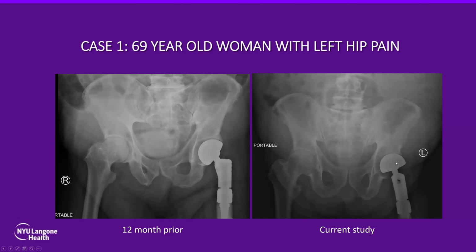But we know that for a bipolar hemiarthroplasty, we have one level of motion between the cup and the acetabulum. So it's a normal finding. So this was a tricky question. I wanted to trick you into saying that this was a total hip arthroplasty and the acetabular component has rotated, but that's not the case. This is a hemiarthroplasty, a bipolar one, and it's totally normal for the acetabular cup in a bipolar hemi to rotate among different examples.